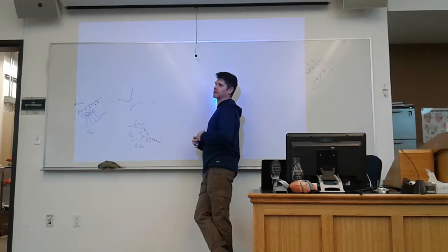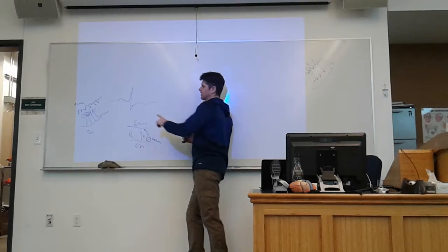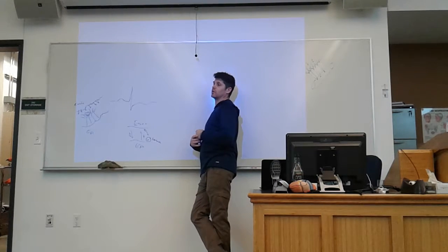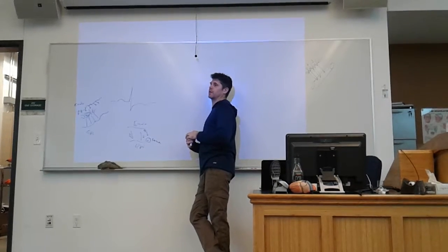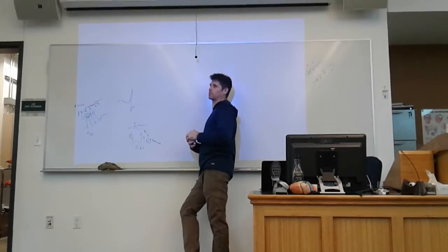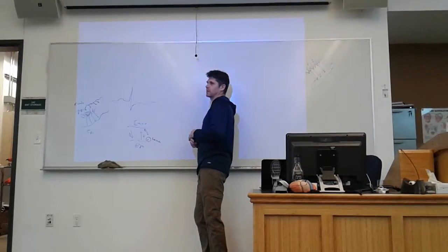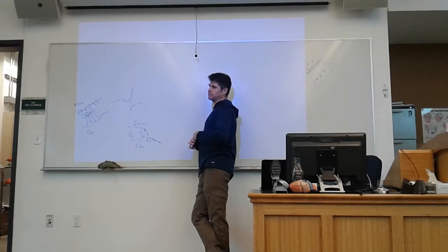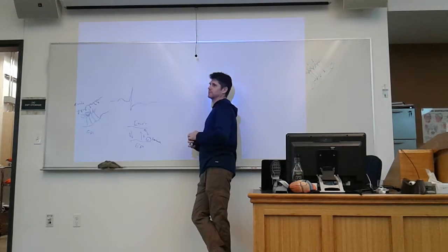But not by much. And that's just because of the level of ischemia. Yeah, the amount of slowness leading up to that will determine the level. So how much depression you have determines how ischemic that tissue is, because that's a representation of how much of the tissue is ischemic. If you reach the point where the cells were super dead and no longer conducting anything, then you wouldn't have ischemia anymore. You would just have an axis deviation away from your ischemia. Correct.